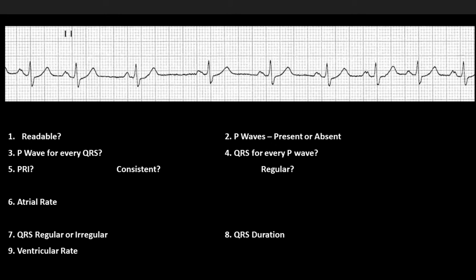And of course, our first thing is going to be, let's take a look, is this a readable strip? And I'm reading through here, I can identify P waves, QRS complexes. Therefore, I'm going to identify this as, yes, it is a readable strip.